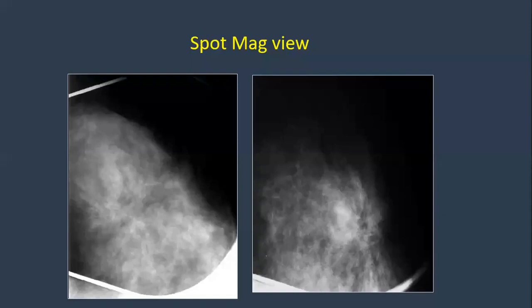So, how are you going to manage the case? Now, this is the location of the previous biopsy. When was the biopsy done? Maybe many months before. This is the baseline, a few months.